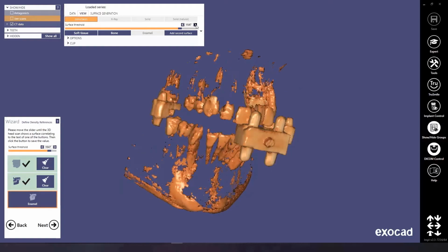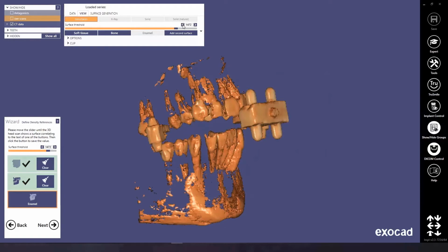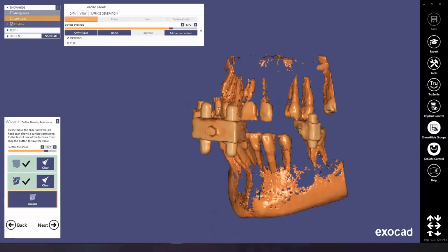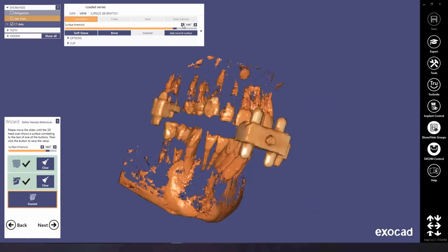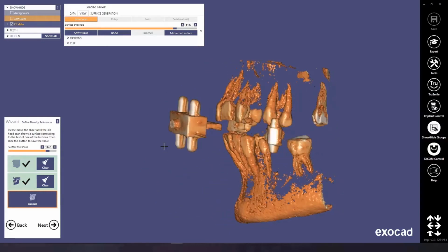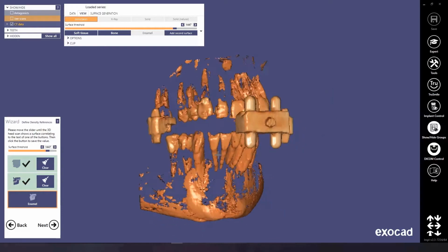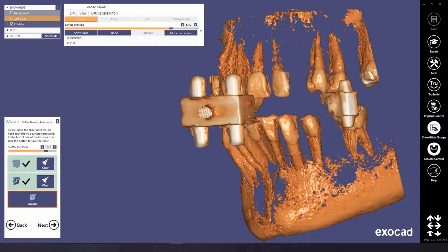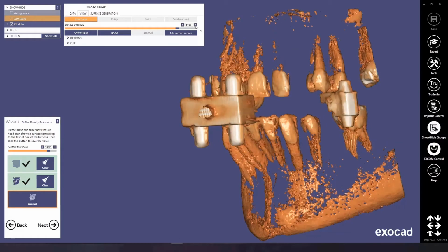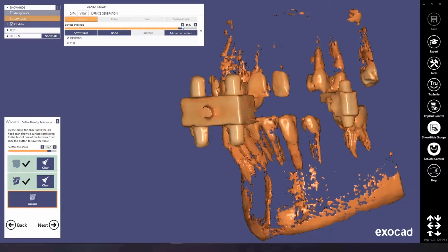Please consider that this selection has to be done with a particular accuracy, because on this isosurface there will be the alignment of the master jaw and the alignment of the antagonist. So it's particularly important to give the software the most precise information for this step. So trying to be as accurate as possible, also by using the icons that you see here, we have to define the best selection of the enamel, and once we're done, confirm once again.